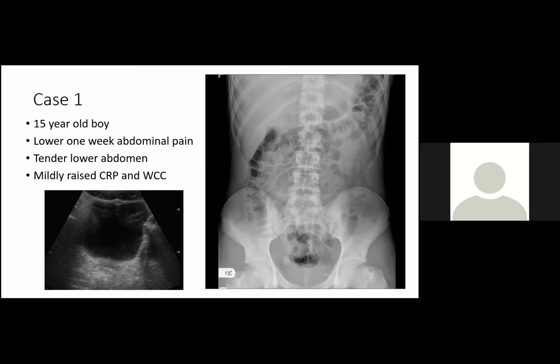So if I can just leave the abdominal X-ray there for a few seconds, whilst you have a look at that. Can anybody see anything on the abdominal X-ray? Feel free to just shout out if you can.